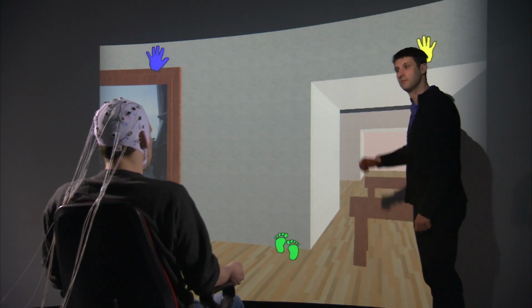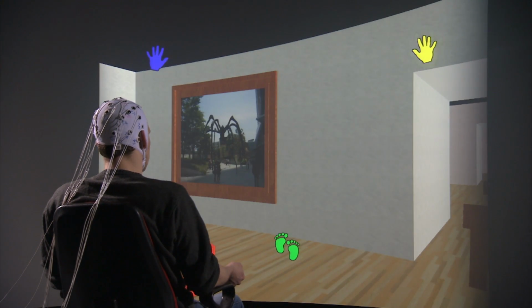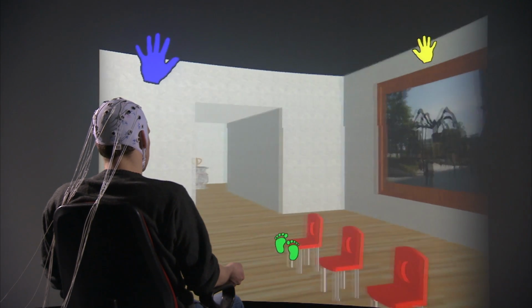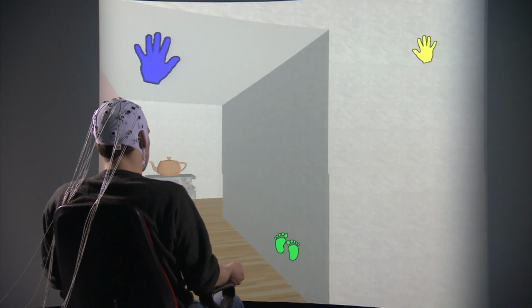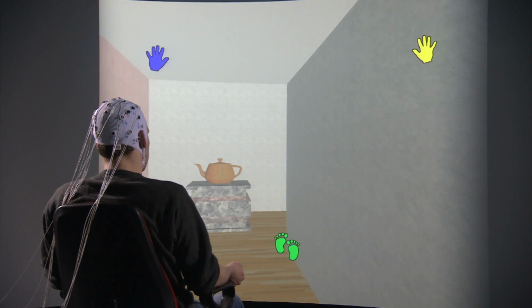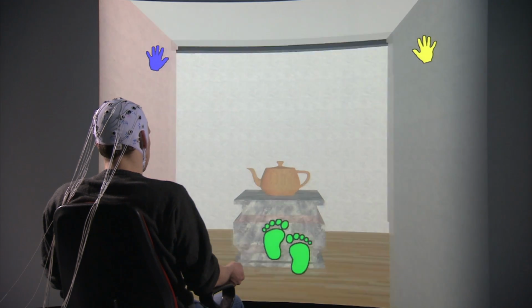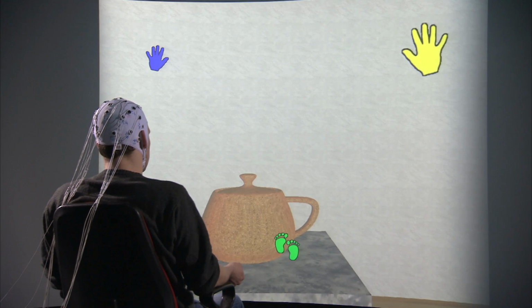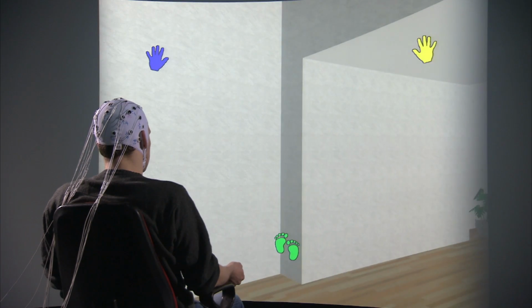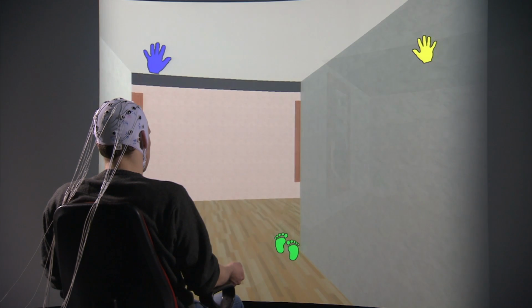This virtual museum visit application shows that the user can move around using 3 basic commands, although this can prove to be slow and tedious for long distances. The application demonstrates another problem. This type of navigation using 3 basic commands rapidly exhausts the user because of the intense concentration required to move around.